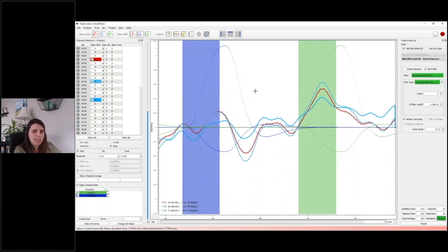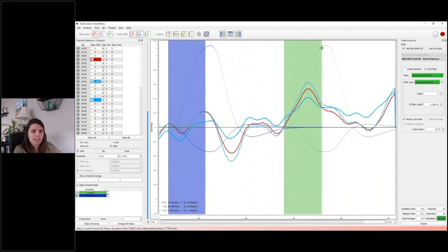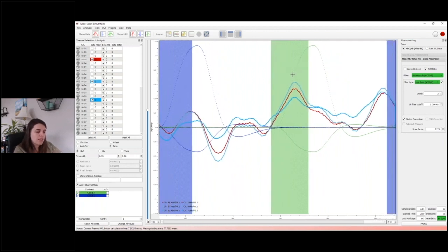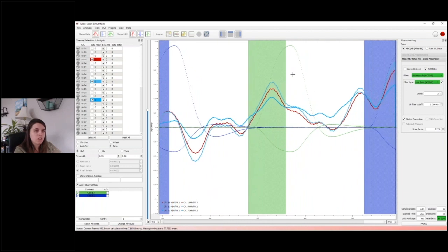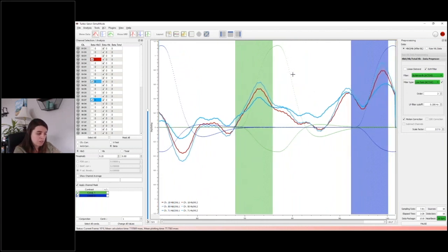And also amplitude is really not so critical. Certainly not absolute amplitude. We don't have to have this exactly match this shape. What we do want to see is a general increase, and we do want to see more activation in certain channels relative to other channels. So we know that, if a channel is right over the motor cortex, we expect to see a greater relative amplitude compared to those that are not.